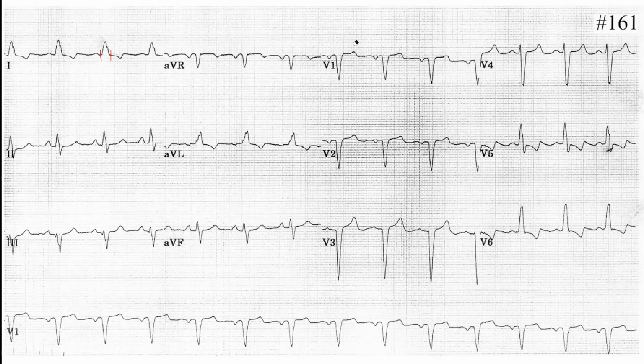Whenever you see the wide R wave, in V1 or V6, where can you see the wide R wave? V6. So, meaning, it's a right... no? Whenever you have the wide R, that area is activated later because the impulse is coming toward this area for a longer time. That means there's a left bundle branch block. If you had a wide R wave in V1, that'd be the right bundle branch block. But because you see it in V6, that's a left bundle branch block.